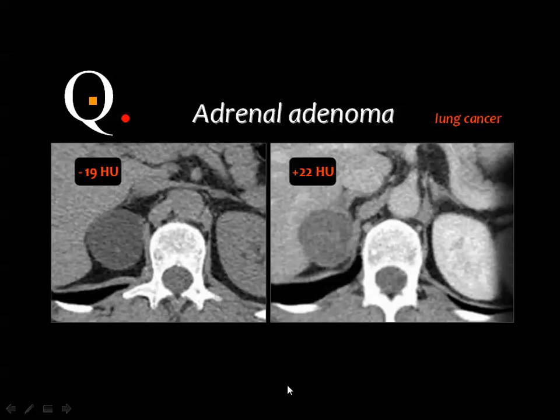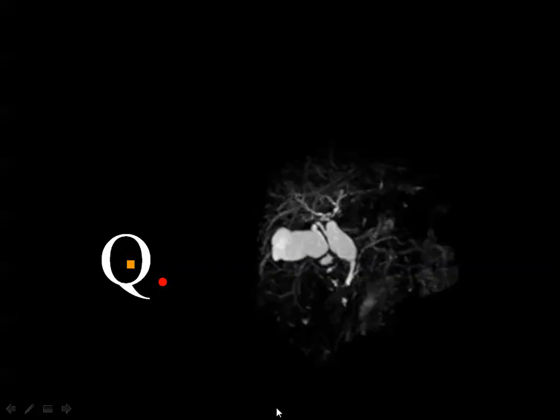Okay. Yes, if you see the reading is minus, and you don't see gross fat by the naked eye, because gross fat would mean that this is a myelolipoma, but you don't see gross fat like this fat, for example, in the retroperitoneum, and the reading is minus, and you know that this is a lesion rich with fat. This is one of the exceptions in the adrenal gland, that the patient may have a primary malignancy and you say no, this is not a metastatic deposit because of the classic appearance of the regular adenoma.